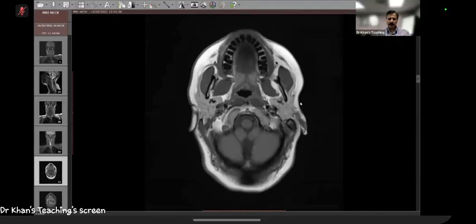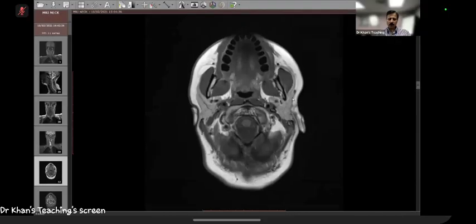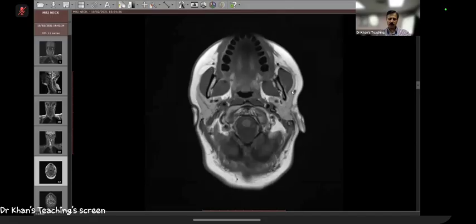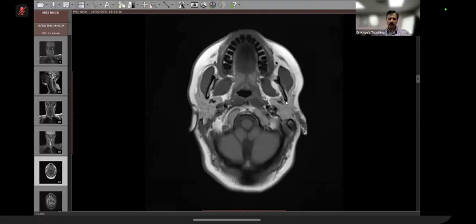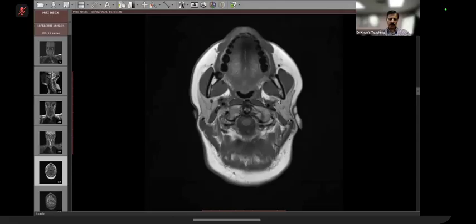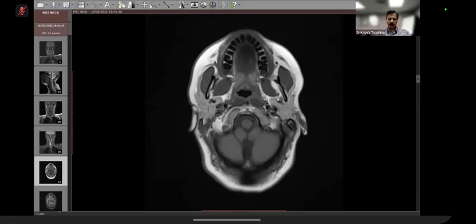And the parotid gland has got two portions. One is this superficial portion. So this is the skin. So the portion which is superficially placed is the superficial portion of the parotid gland. This one is the deep portion. Deep portion is clinically not evident, which makes common sense because a clinician will not see it.